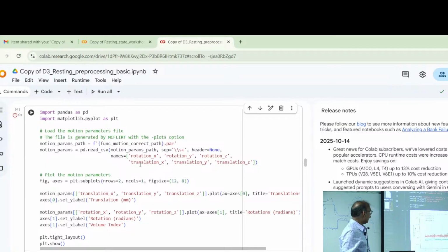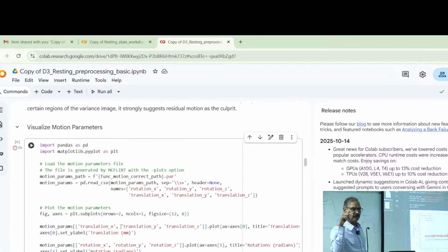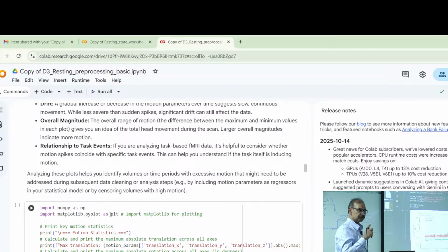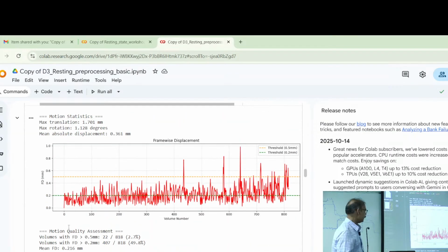Right. So this person, so the last one, right? The range. Does anyone remember the range? We were saying, oh, it's between minus 0.05. No, it was minus 0.05 to plus 0.15, right? Yeah, and so we were saying the subject is a good subject. In this case, though, this is 1.5, so this person did have some motion, right? Right, this is the frame-wise displacement. And in this case, if we set the threshold at 0.5, there are several instances where the person has moved, okay?